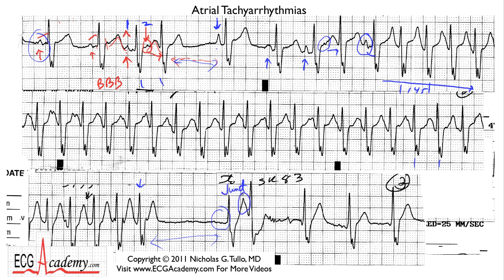And then there's an APC right here that gives rise to this QRS. And then you have a P wave that conducts, another P wave that conducts, and you're not exactly back to sinus rhythm. This is obviously a patient with a lot of different complex atrial arrhythmias. But this is the part I want to show you.